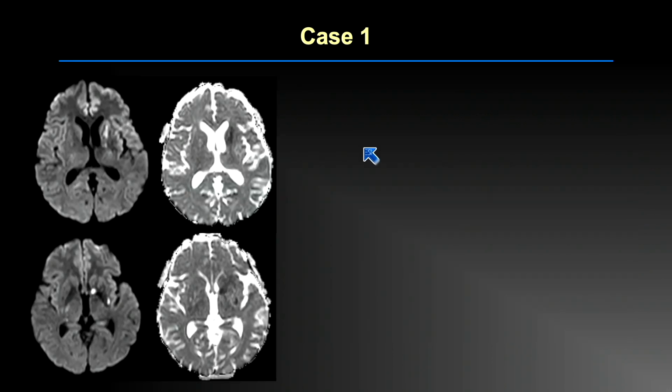They follow this by MRI. At this point, basically, the clinical suspicion is stroke, code stroke. And you can see in this MRI, in the regions of hypodensity, reduced diffusion in the basal ganglia, in the internal capsule there. And then, even on the other side, there are some small areas of reduced diffusion in the thalamus and posterior limb of internal capsule.